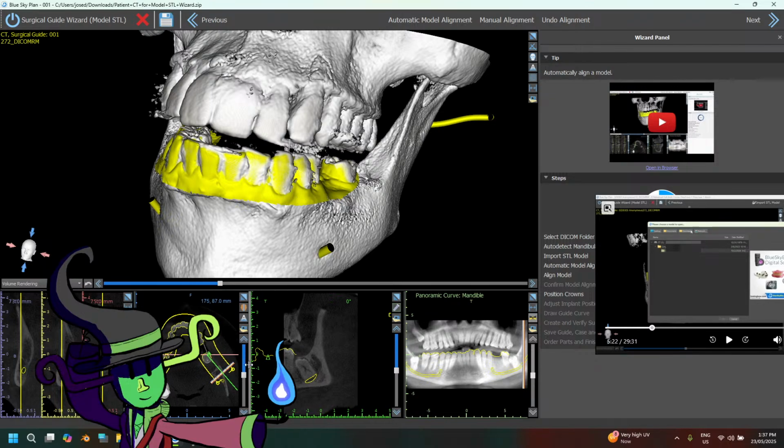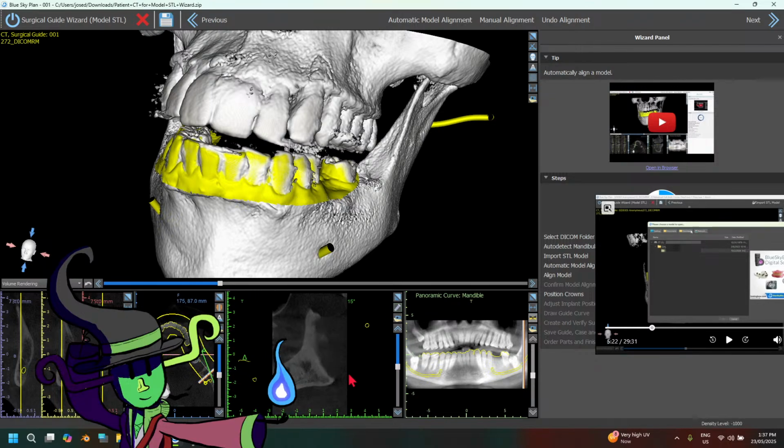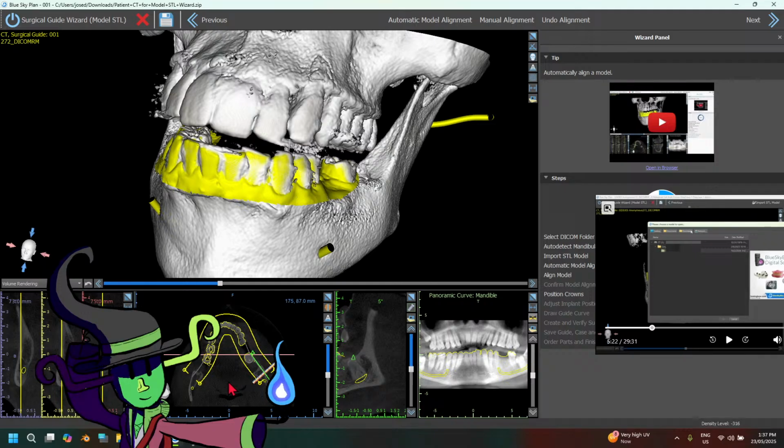So, let me just see if this is all fitting within the. Oh wait, actually, I think this could be. Yeah, it should be this way. Yeah. Frick. Am I supposed to explain? Am I gonna explain to you guys how this all cross sections work in Blue Sky?